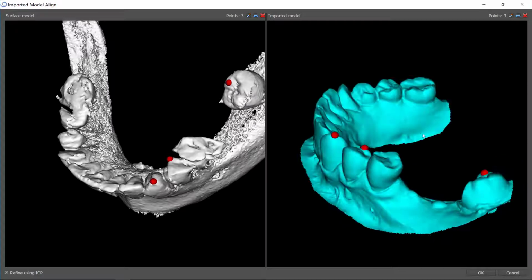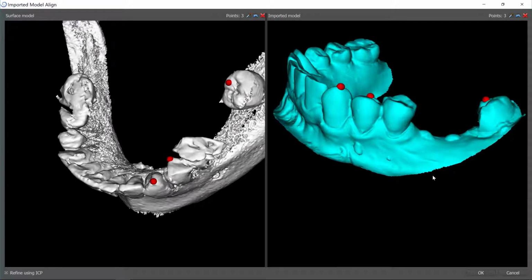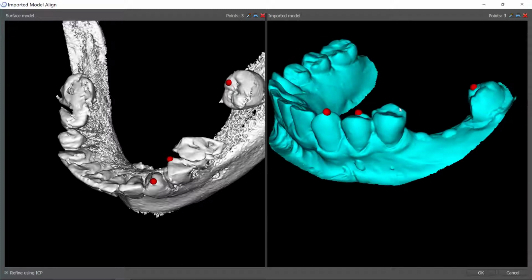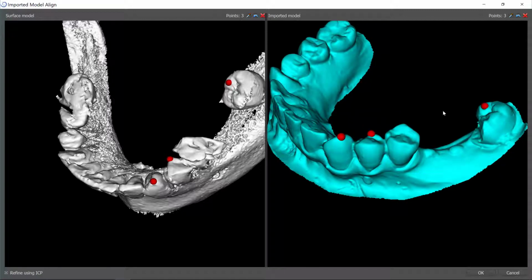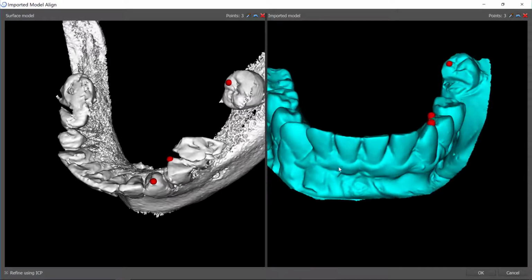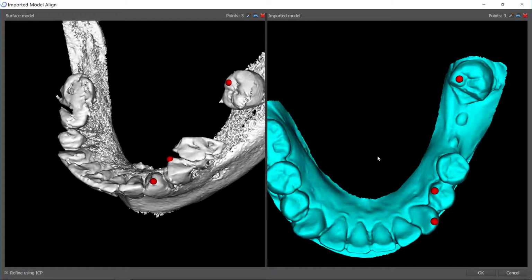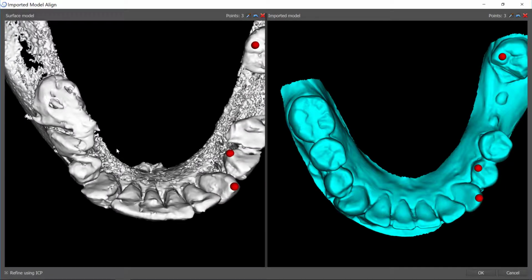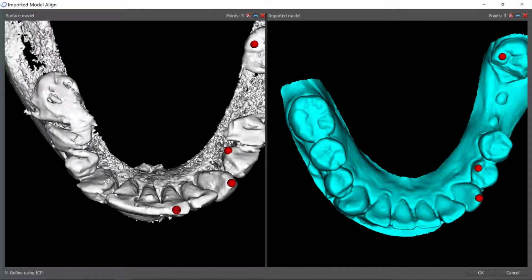And I should also mention, do you notice how, because we know we're going to need to get rid of that mesial half of the tooth, before this STL was created, we just used a burr to cut off the mesial half of that tooth. That way our STL matches what we're going to plan on doing in surgery. There's digital ways of doing that, but nothing beats a good old handpiece just to lop that piece off. All right. Continuing around my stitching points.